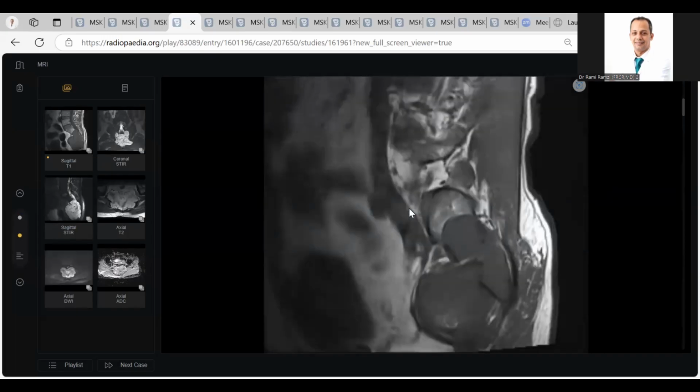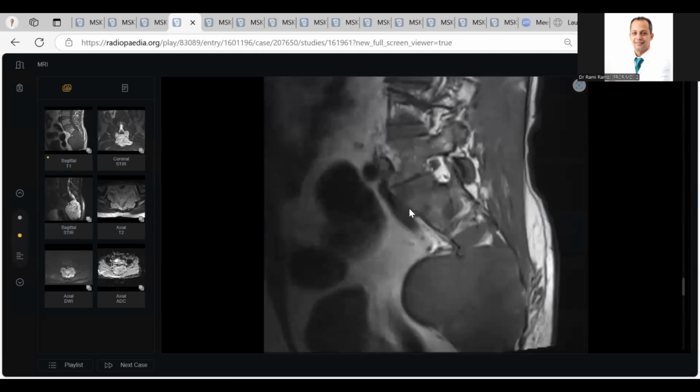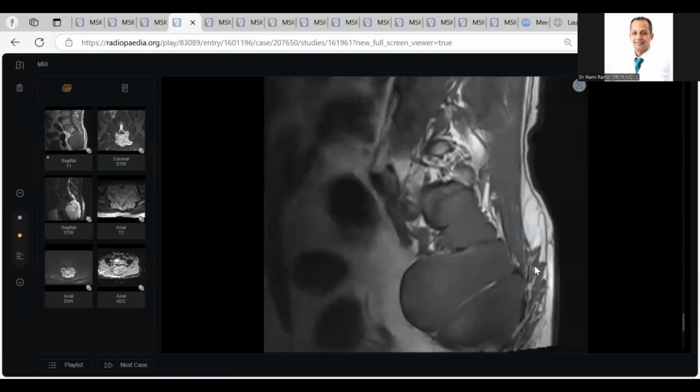This scan. You have the control, I think. Do you have the scrolling control, or am I scrolling? No, no, scroll. I could not scroll.